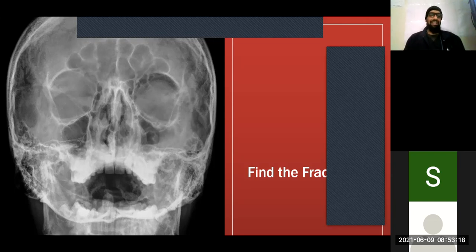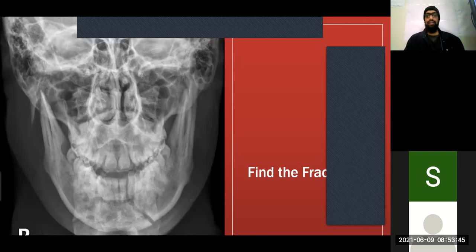But what I'm saying is these are the subtle signs sometimes that we can use. Will this guarantee that you find every fracture? No, but you'll find 99% of them. And the other 1% are those where it's so clinically clear that this patient is not okay, but I just can't see anything. That's when you're going to ask for senior help, radiologists, possibly just CT without anything obvious on an X-ray. Okay, good. Right, let's try another one.